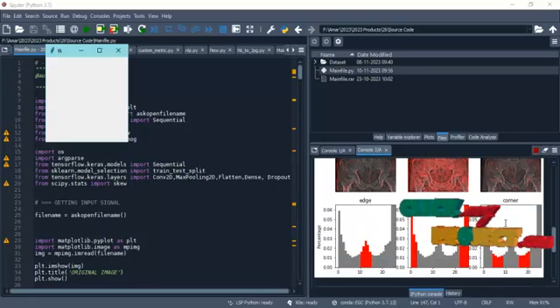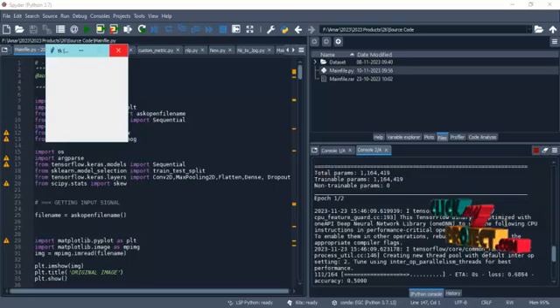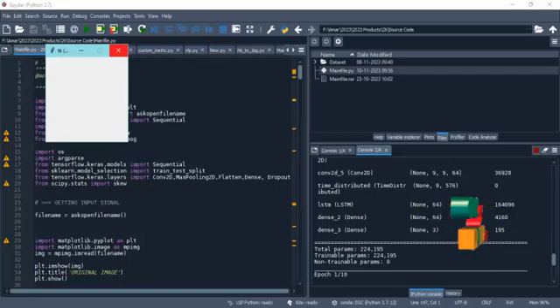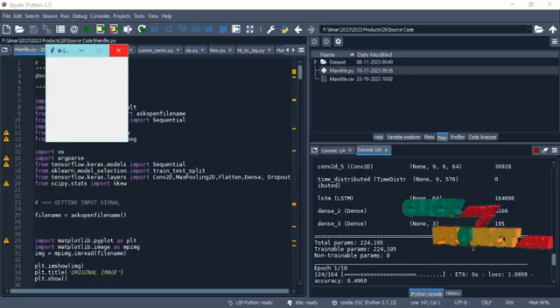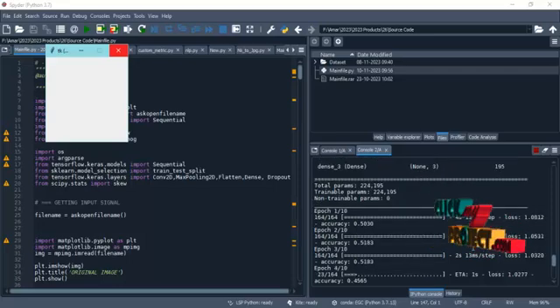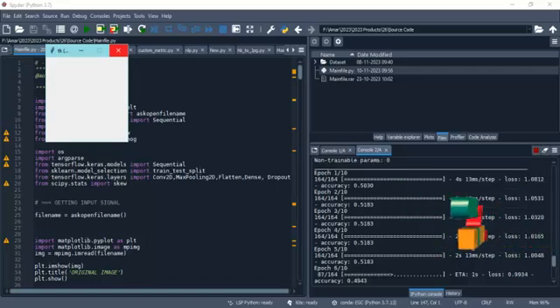in the console window. During the execution it will take some time, because after importing the images, the overall dataset images will be trained by using the local binary pattern algorithm. Once the features are extracted, the convolutional neural network layers will be executed one by one. These are the epochs we have assigned for the layers. Around 10 epochs we have given, so the epochs will run one by one.